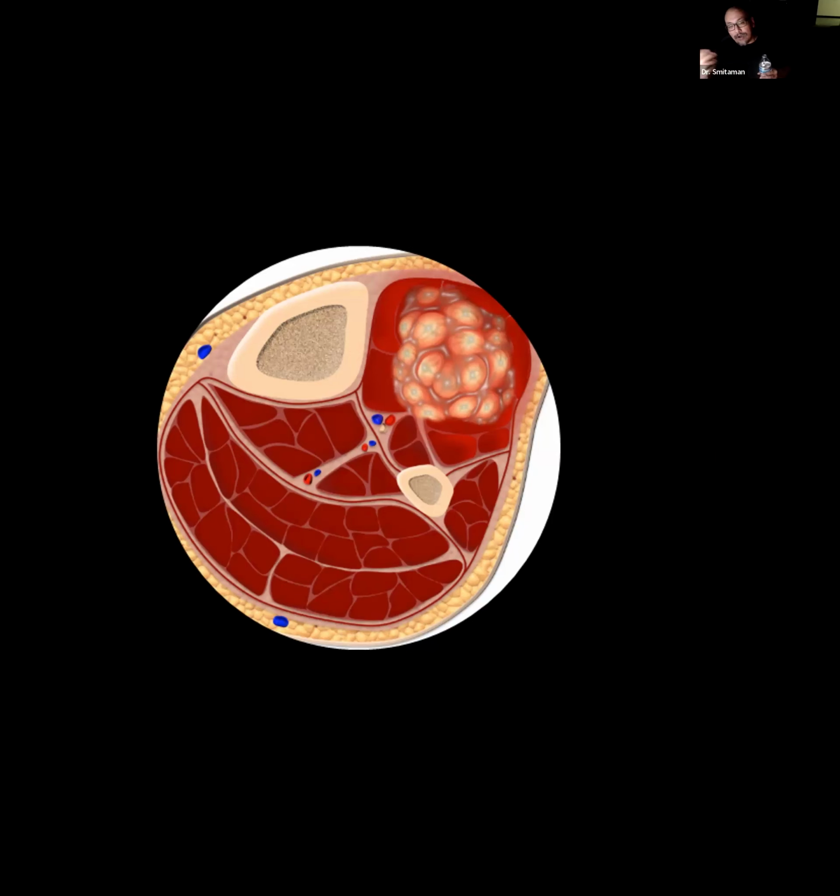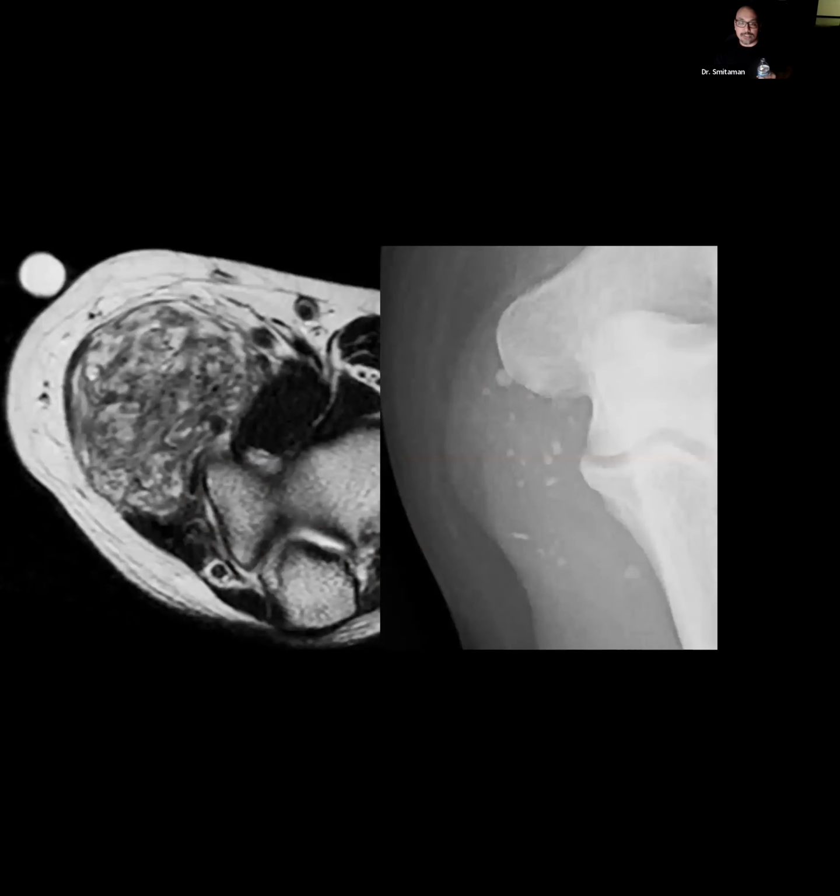In some cases, though, and I'll show some of these here, MRI and imaging can provide us with a specific diagnosis. Here, a nice case of what used to be called a hemangioma. I encourage us to use vascular malformation as our terminology, but what we see here is this large mass at the ulnar aspect of the elbow that has septae and fat insinuation within it. Corresponding radiograph, cone down and cropped, obviously showing the sub-centimeter phleboliths, diagnostic of a low-flow vascular malformation, or what some people may call a hemangioma, just so you're aware.